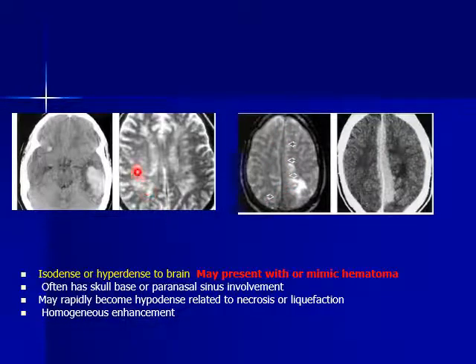More than this, these tiny hyperintense T2 foci in the white matter, you will call them white matter disease. But if you inject contrast and see enhancement in these lesions, these are leukemic infiltrates. Another example here, hemorrhagic lesion. Actually, it is a leukemic infiltrate with some hemorrhage. If you give contrast or do MRI with contrast, you will see enhancement. Bland hemorrhage or parenchymal hemorrhage shouldn't enhance.